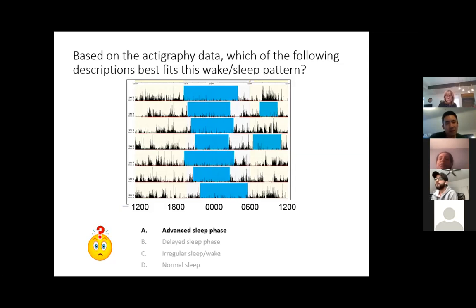Yep. So that's how you do this, you've got to look at what time people are waking up. And in your exam, you'll be able to actually read it. You can't in this thing that I put there. That's why I put the times there for you. So that's your clues. All right. Ready for more fun? Let's do it.